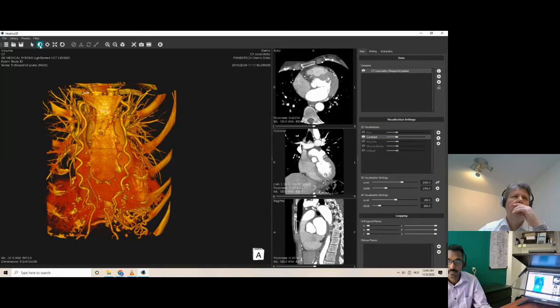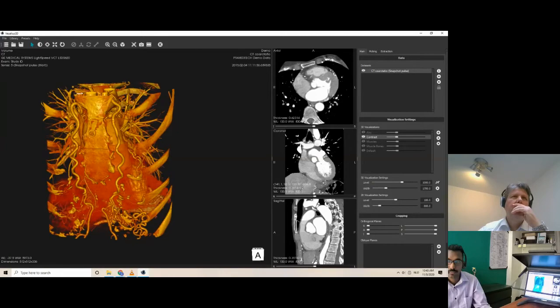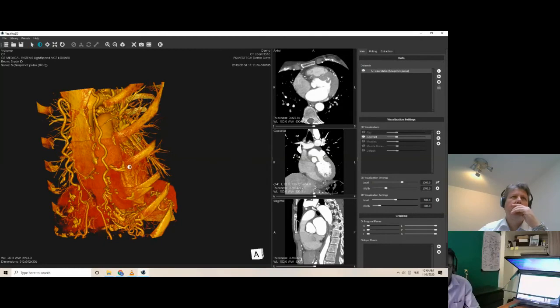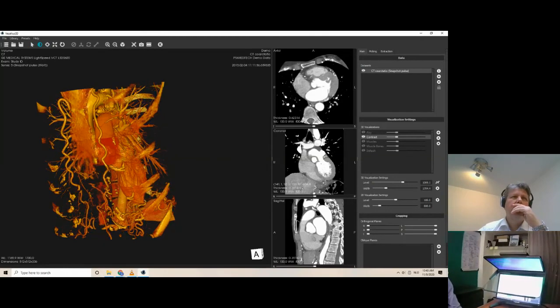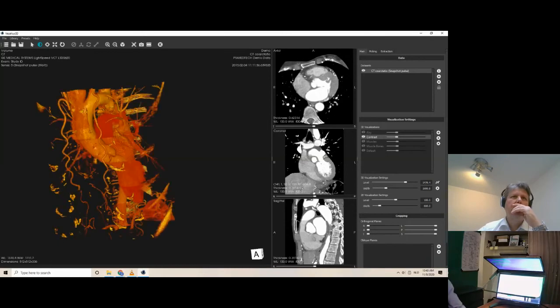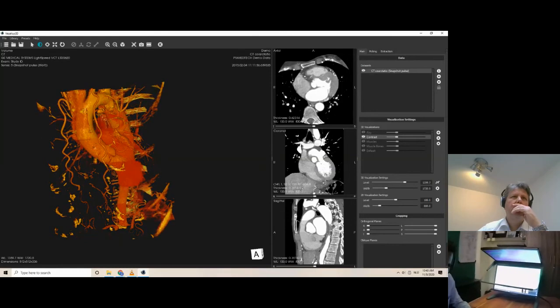This little button is my power button. I love it. And why do I love it? I'll show you. Let's turn the data set a little bit around. Power button on, and I can change the level and width settings. Have a look what it does to the data. So basically, I'm going there slowly to, oh, my machine is, I should have restarted it. Sorry for that.